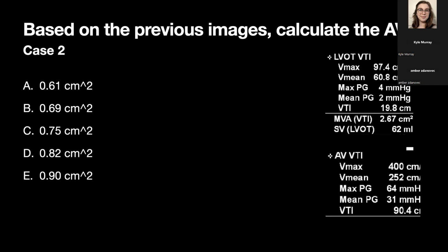And what do you get when you multiply those together? What is that? The area times height. Sure. What's the last LVOT value for you there?